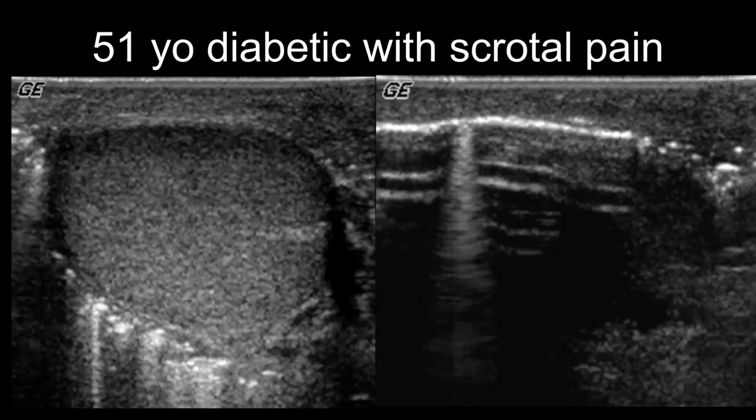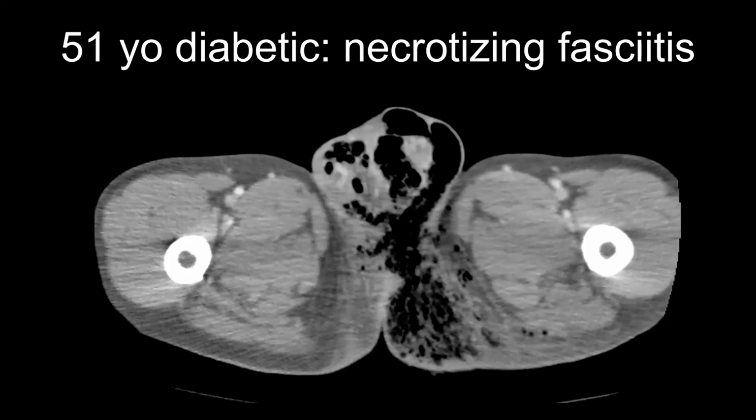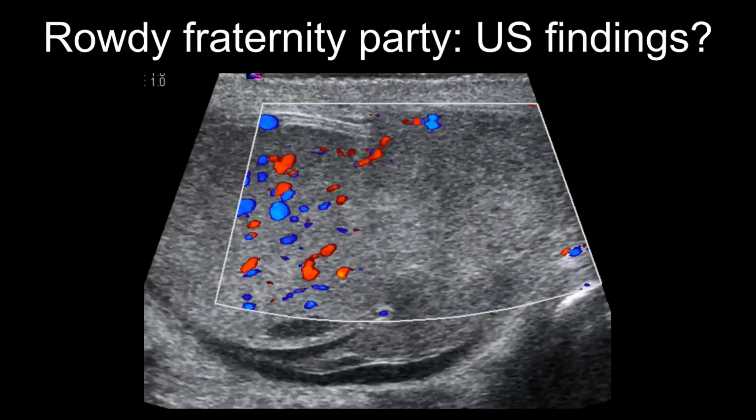It's our job as radiologists to communicate the urgency of this finding. This is what this patient's CT looked like. He had extensive involvement. Moving on to another category.